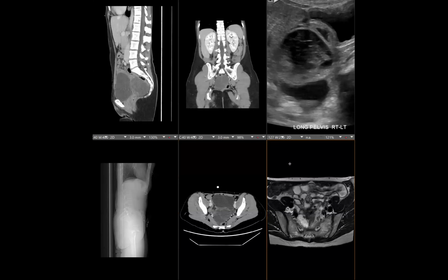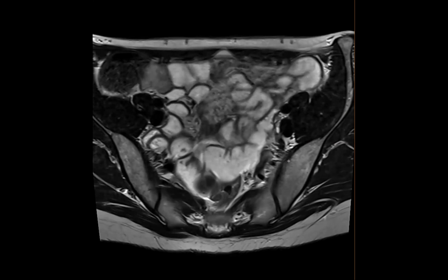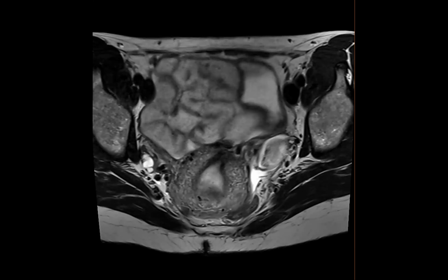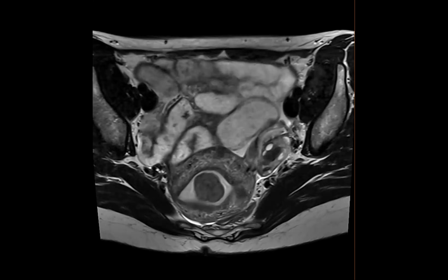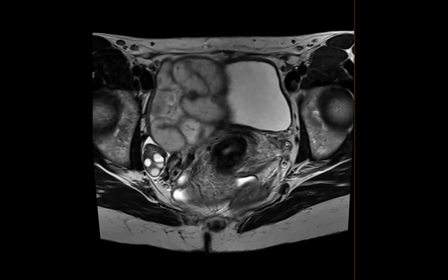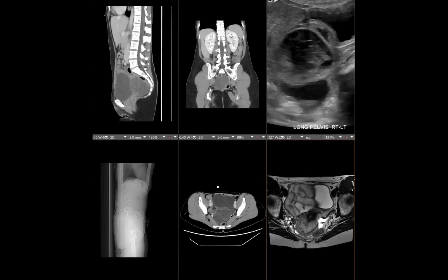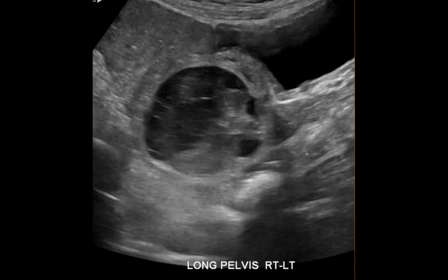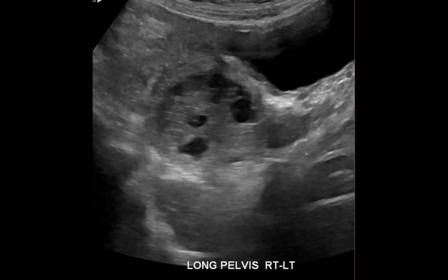So let me give you the MR, but this was a handful of months prior, pre-op to endometriosis surgery. And this is what the pelvis looked like. Patient had a polyp or a fibroid, maybe a polyp. And the patient got an ultrasound after the CT.